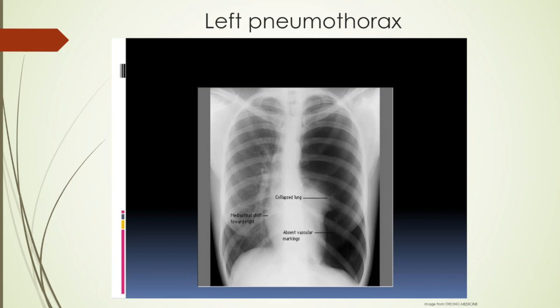And this one here is, again, pretty easy to see. To go back to our method, you can see the trachea coming down. It's pretty difficult picking out the carina, so it makes it a little difficult seeing the carina in this picture. And I know I've talked about the thoracic vertebral bodies, and even those are kind of difficult to see here as well.